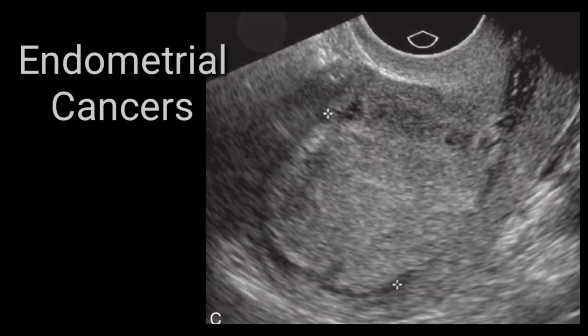Endometrial cancer is a very important topic. It needs a separate video and different images to understand endometrial cancers, but in short, just for an introduction, this slide has been added. You can appreciate how big this endometrial thickening is. You will never see this in normal beings, unless there is some pathological process. So this is what endometrial cancer looks like.